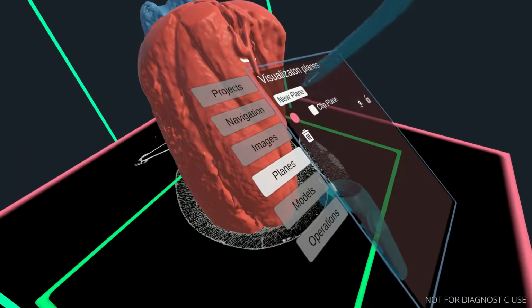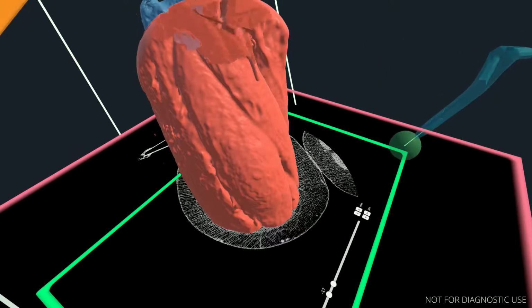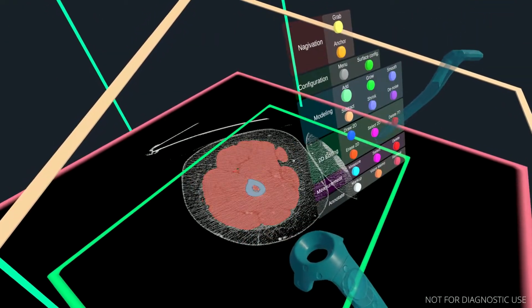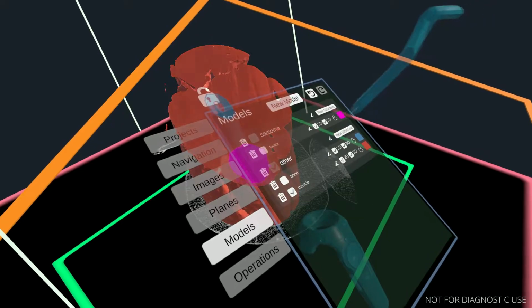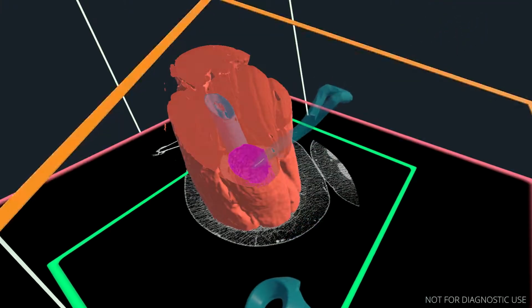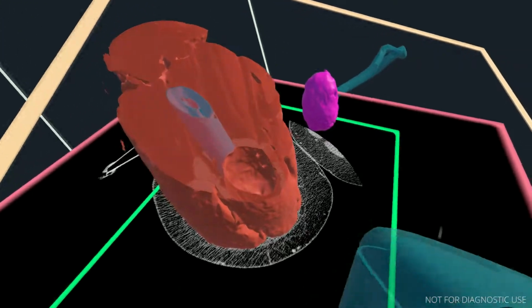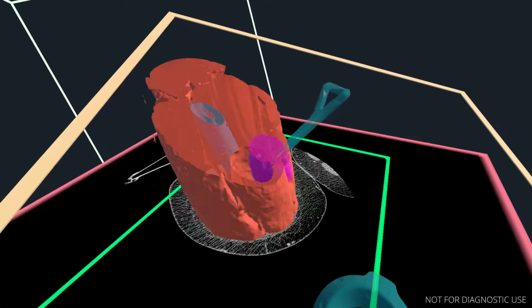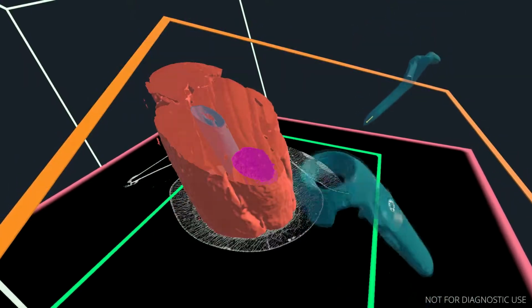Actually, no, let's look at it with a clip plane. So we can kind of see the gap that the sarcoma would leave in the muscle. If we go to the grab tool, let's just unlock the sarcoma model. We can pull it out. And so you can really see the gap that would be left by this tumor if it were resected. So it's eaten away at the muscle, or at least grown into it. Why don't we put it back? There we go.